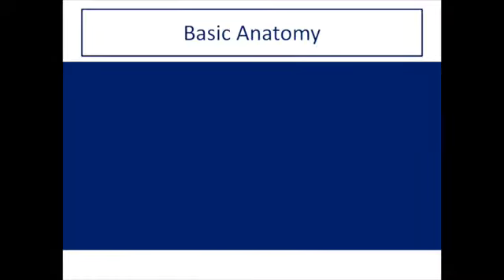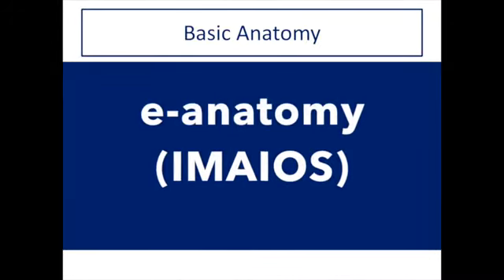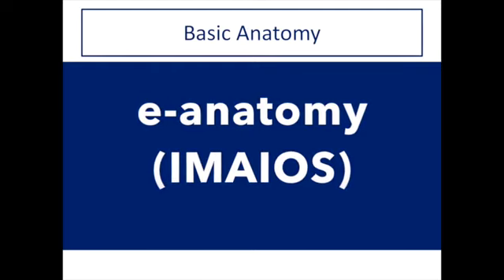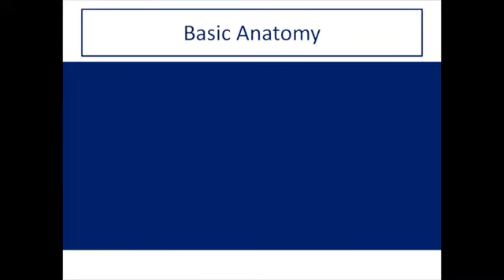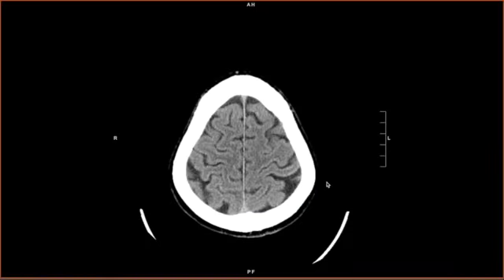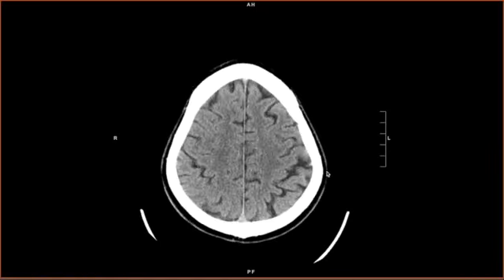If you're going into radiology, you're going to need to know way more anatomy than this. I strongly suggest subscribing to eAnatomy, also known as IMAIOS. You can take your time learning the cross-sectional anatomy in detail. So, here is a normal CT scan of the head.